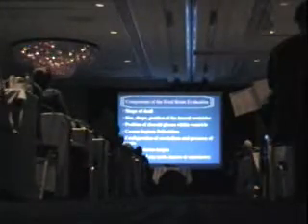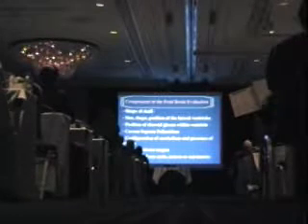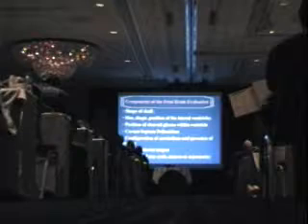First of all, what are the components of the fetal brain evaluation? First of all, you want to look at the shape of the skull. And the shape of the skull can take on various shapes. It can take on, as you're familiar with, I'm sure, the lemon sign that we're going to see in a minute, which is associated with an open neural tube defect, and that's sort of a pointy aspect of the frontal portion of the skull.